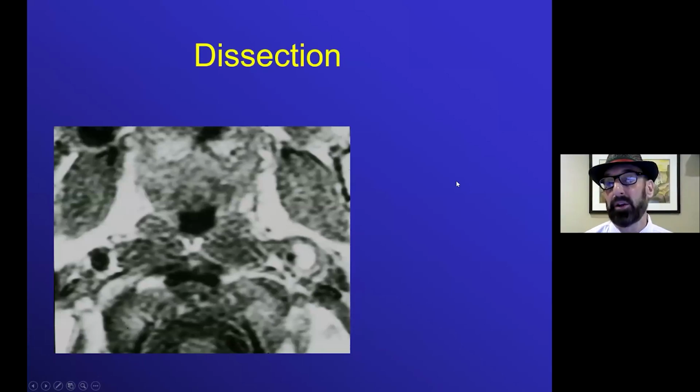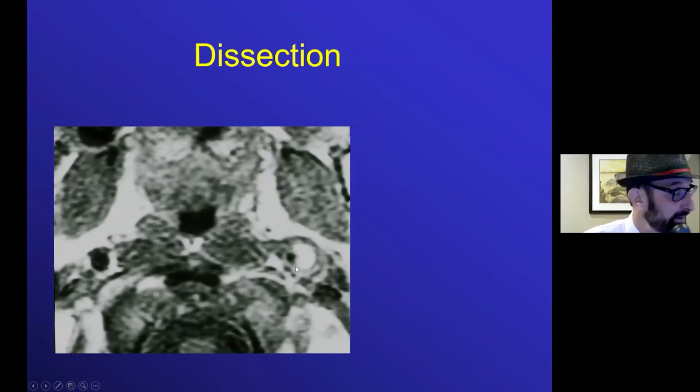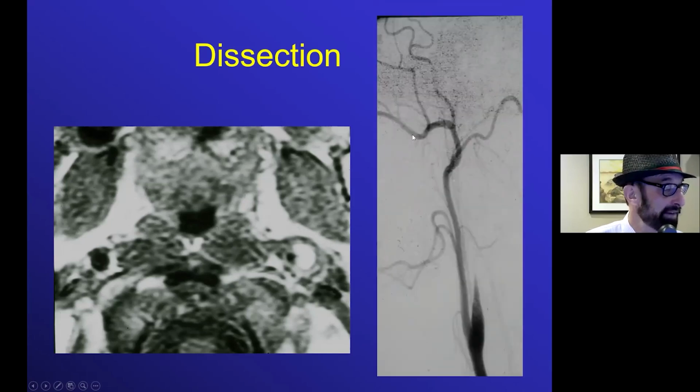Obviously, the other thing that we look at when we're looking at the blood vessels in the neck is not just atherosclerotic disease and intraplaque hemorrhage, but wall hemorrhage, which may occur under such circumstances as trauma or fibromuscular dysplasia or other vasculopathies. And here you see a carotid artery which is narrowed and has this bright signal intensity from a wall hemorrhage. This is pretty high up in the neck. This is not at the expected location for the carotid atherosclerosis at the bifurcation.